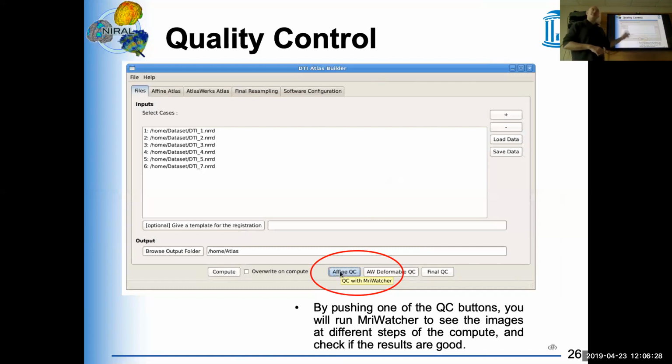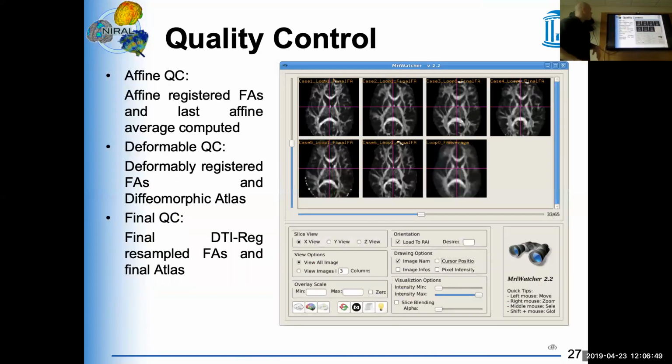The other thing that you sometimes see is if, let's say, your process failed while writing a data set, let's say there was not enough space on the disk and so on. Then you will have maybe a partial image on disk, and that case may be bad too. That's the other possibility.